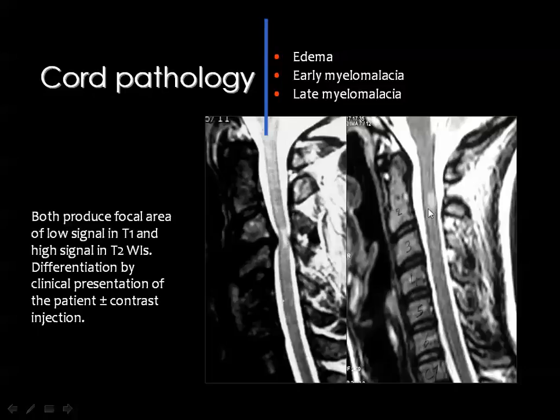But here the cord is not touched by any lesion, as you can see, and this is in the differential diagnosis of intramedullary lesions. We'll discuss this after that, but we are concerned now with this shadow, which is the result of disc lesion as well as ligamentum flavum hypertrophy compressing the cord, resulting in this abnormal intramedullary signal.